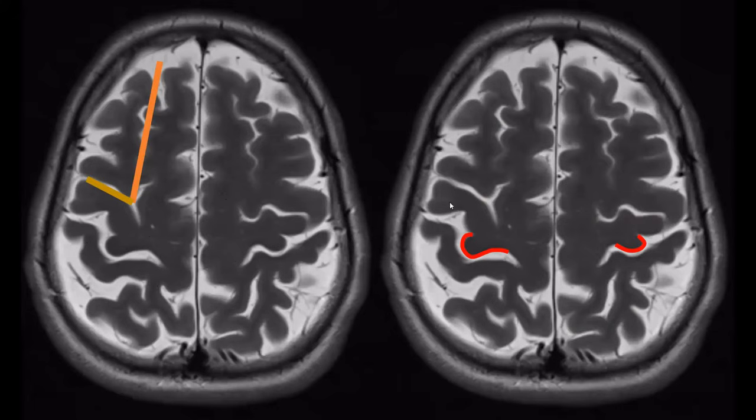And what do we see on the precentral gyrus on both sides? It already appeared in red. We see that the precentral gyrus contains a bit of a knob located posteriorly. And this is the so-called hand knob, because this area contains the motor representations for the contralateral arm and, well, the hand and the arm. Information is organized somatotopically in both the pre and postcentral gyrus.